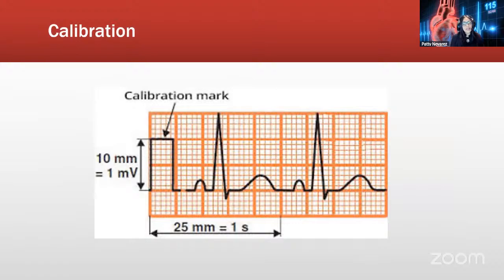When we put it together on an EKG, we brought now the EKG that we have seen before in the class before. We're going to have to check the speed is 25 millimeters per second, and the amplitude or the voltage is 1 millivolt, or 2 large squares. Okay, and then we can see here our EKG that we already talked about, the P wave, QRS, and the T wave, that's 1 beat, and then it continues to the next beat. It's going to start making sense, but make sure the calibration is done right. What is the calibration? 25 millimeters per second horizontally on time, and then vertically on the voltage, it has to be 1 millivolt or 2 large squares.